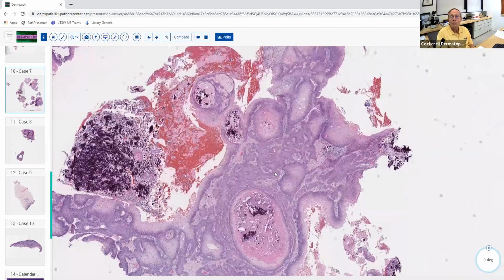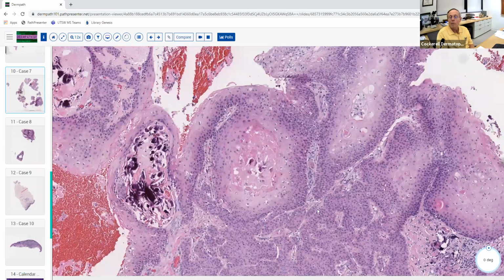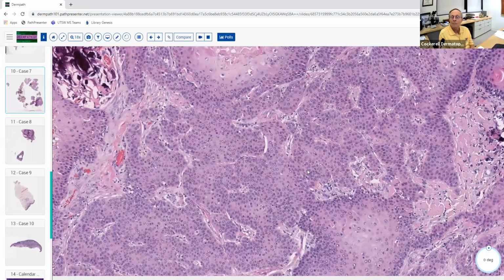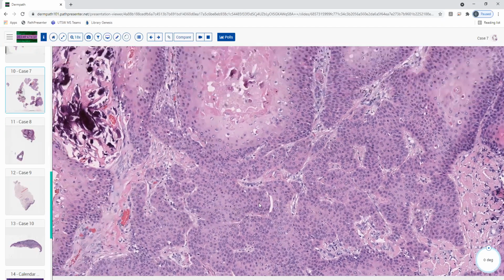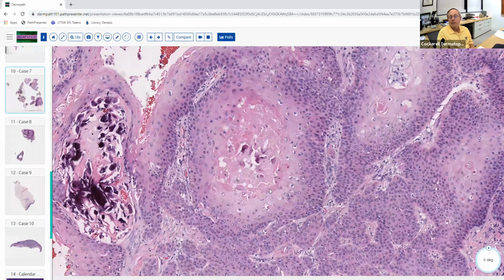So in this case, you have to look at ancillary features. So we say, well, let's take a look at the individual aggregations themselves. What else are we going to look for to see whether we think it's more likely to be benign versus malignant? Yeah, the squamous epithelium has kind of a rolling, scrolling appearance. And then there was a different area where it looked like there were a few different cysts going on. Yeah, exactly. If we talk about a cyst, it's got to be an epithelial lined structure, and we've got that, I think, right here.